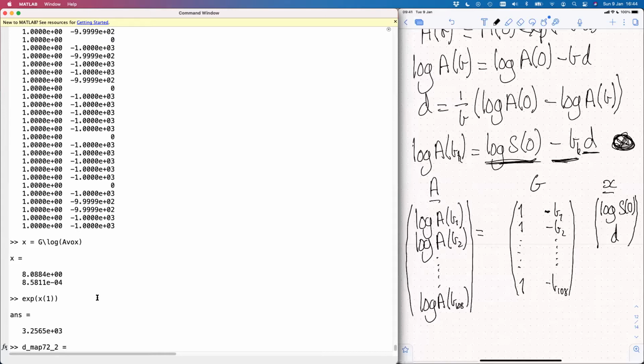Of course, zeros. I'm going to create an empty matrix first of all to put the answers in as we compute them. It needs to be the size of the image slice, that's 145 by 172, and then have an extra dimension of 2 elements, because I'm going to put both elements of X into this array as we calculate them.